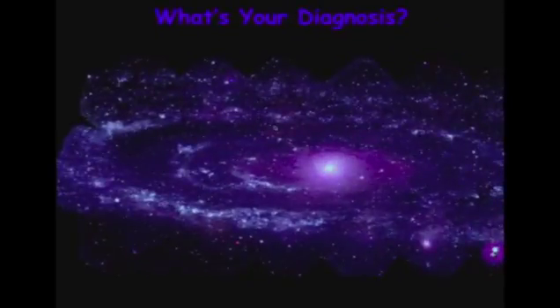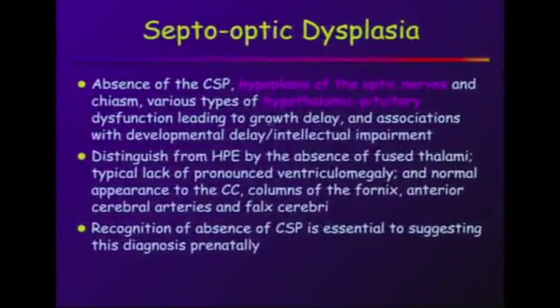So what's your diagnosis in this case? This is septo-optic dysplasia. This is absence of the cavum, hypoplasia of the optic nerves, and various types of hypothalamic pituitary dysfunction that lead to all sorts of problems there. It's interesting, they can actually diagnose this in utero by testing hormones in mom's urine because the fetus should be producing hormones that don't get produced if you have hypothalamic pituitary dysfunction, and you can measure that in mom. If you're a lumper, this is the most mild form of holoprosencephaly. If you're a splitter, it's a second diagnosis.